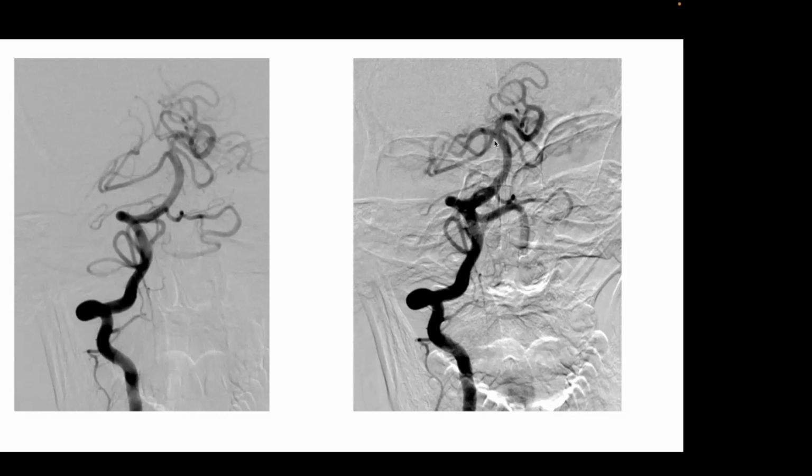This is after thrombectomy. And so here you see the normal appearance of the posterior cerebral arteries and the normal V that appears at the top. And again, this is where the perforator branches are going to come off. Also notice how this is probably an older patient, you develop this dolichoectasia, which is a little bit of enlargement and a little tortuosity of the basilar artery, which creates so much trouble for us on CT imaging because of the asymmetry that will occur from this sort of tilt that occurs at the top of the basilar.